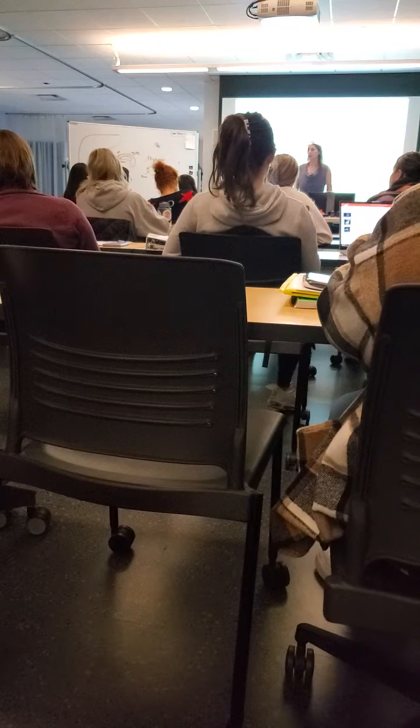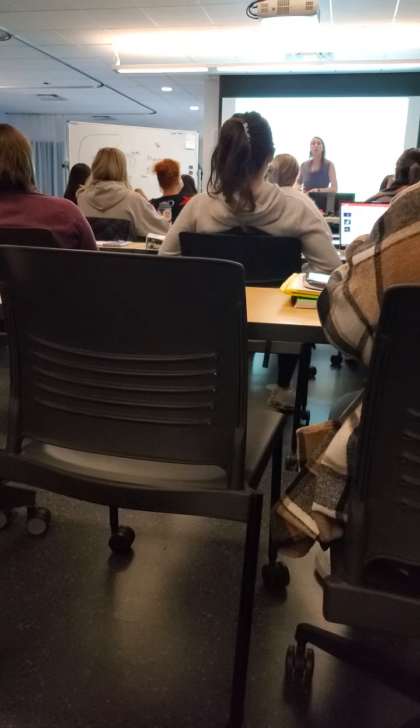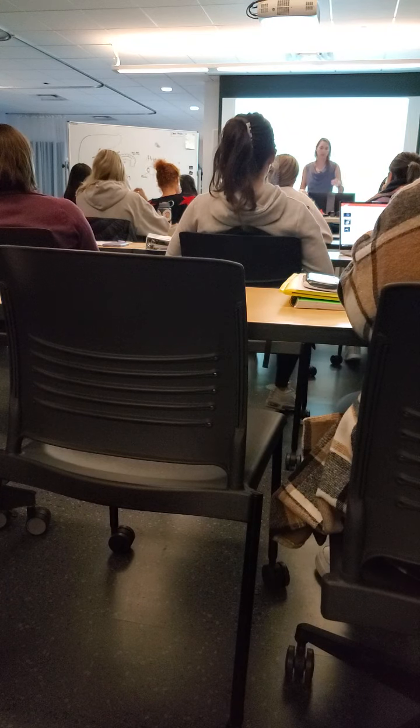Then the wall, and what were the ducts? And then Murphy's sign is something we'll talk about in pathology. That's just a way to gauge tenderness. If I have an ultrasound Murphy sign, my patient can be tender to the probe, and they're like, oh, hey, stop that. Ow, I'm poking them. But I have ones who try to run away. That's a positive Murphy sign. It's very specific to the gallbladder. We'll talk about that later on.